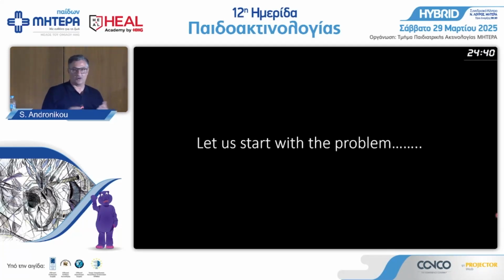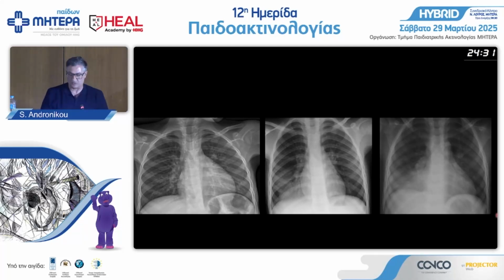Okay. So let's start with the problem. We need a problem that we need to solve to be important or to be useful. I put 3 X-rays for you. Maybe you think the one on the left is normal. I'm trying to tell you it's normal. It's as normal as I think you can get, a decent quality radiograph. But the 2 radiographs on the right are both abnormal, okay?